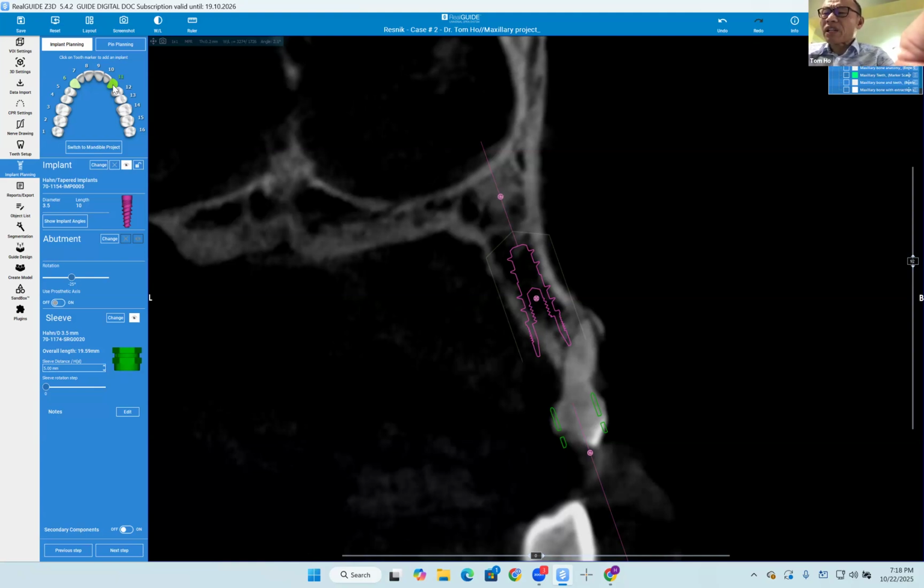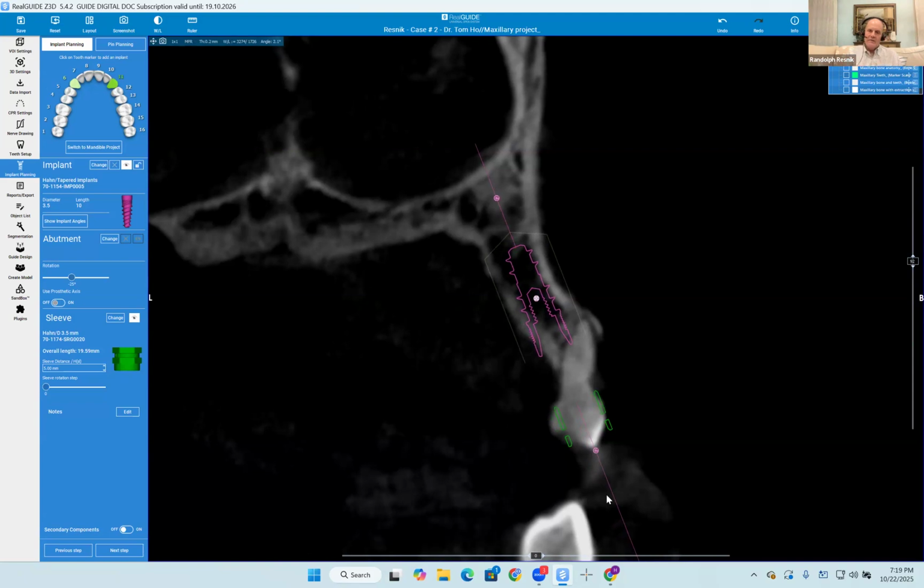I'm sorry, but on the lingual there is an implant exposed on the lingual. Yeah, so I would still graft it like on the other side. Great. Hussein, you know what? Just move the superior 1 click. There you go. I like that better. That'll even be better. And you can always do screw or cement retained on these too if you have to.